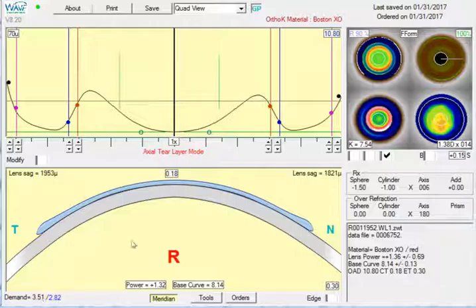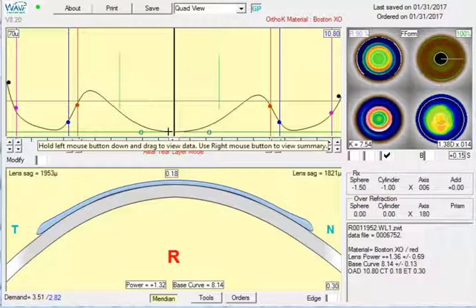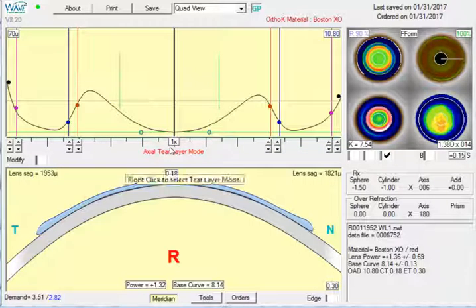So in terms of a refraction, the patient's doing a little bit better. The vision still isn't that great in that eye, but we don't have a very well-formed central steep area. We might run into a case where the patient just has a little bit too much going on in the center of the pupil. If this lens works out for both distance and near, what I would recommend doing is just mimicking this for the left eye as well. Or you can even maybe just decrease the overall power a little bit for a modified monovision effect.